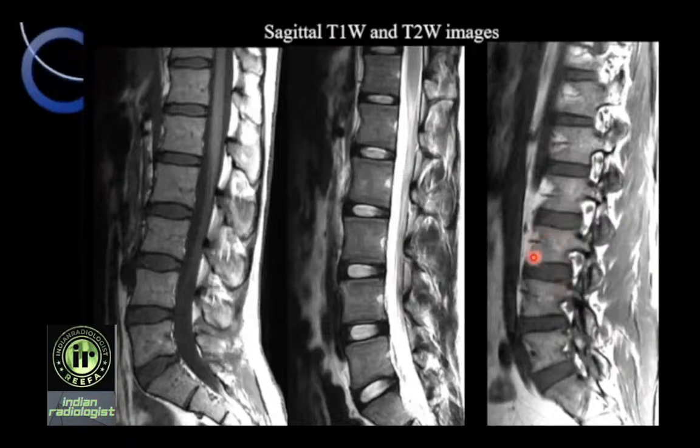What we see here is vertebral body, pedicle, superior articular process, inferior articular process, which is actually better seen here. This keyhole-like thing is the neural foramen through which the exiting nerve root is coming out. We're going to talk about that in detail a little later.